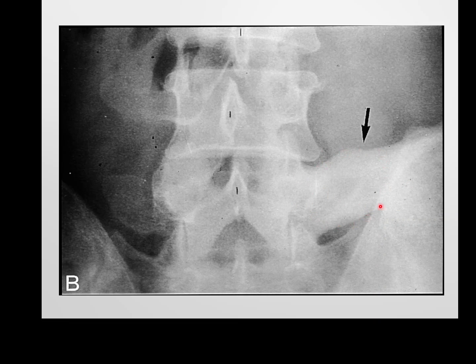So we're not talking about a blastic lesion, blastic mets, anything like this. This is very smooth, very linear, spreading from, like I say, the transverse process of L5 over to the iliac crest. So that is your HADD within the iliolumbar ligament.